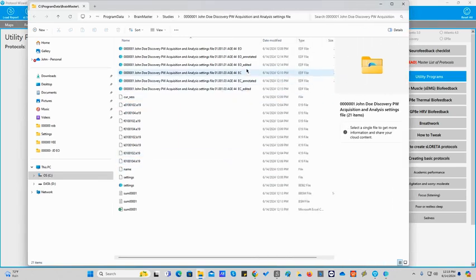And what do we see? We see the original file, eyes open and eyes closed. And then we see an edited annotated file and an edited compressed file that is splice edited. And again, for eyes closed, we see annotated and then splice edited. And that completes the QEEG process. We have acquired the data and then we have edited the data. It is now ready to be processed.